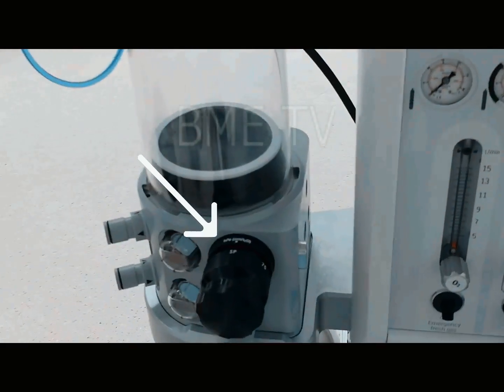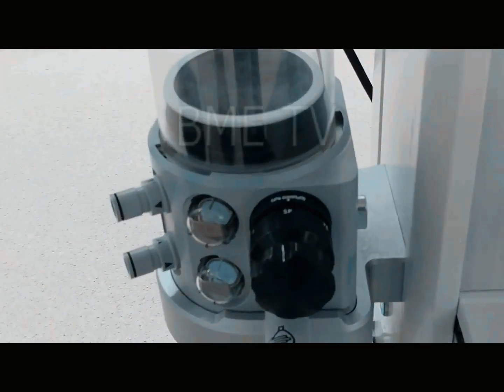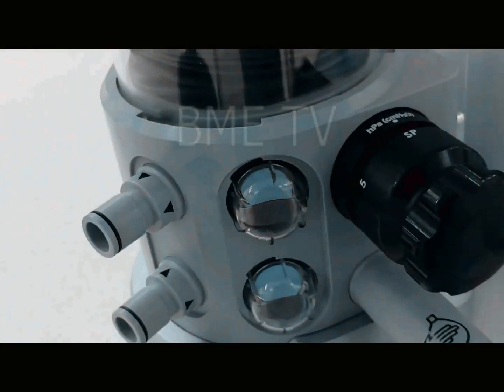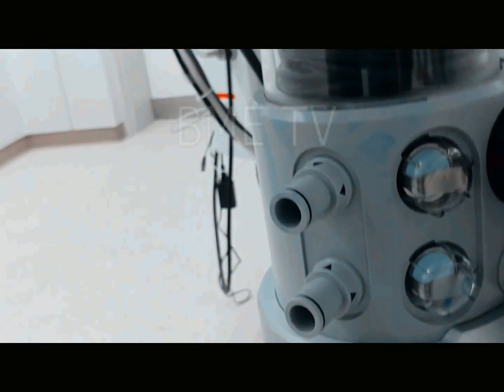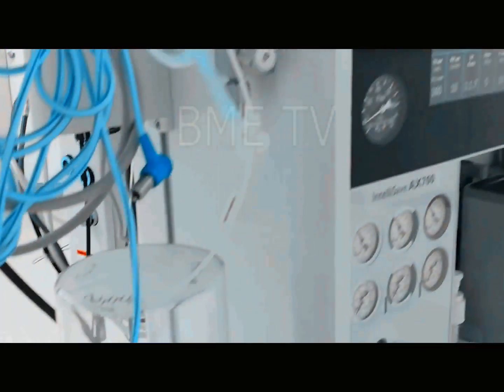First is the adjustable pressure limiting, or APL valve, and it allows a variable pressure within the anesthetic system using a one-way spring-loaded valve. At a pressure above the opening pressure of the valve, a controlled leak of gas is allowed from the system, which enables control of the patient's airway pressure. The minimum pressure required to open the valve is 1 cm H2O. A safety mechanism exists to prevent pressure from exceeding 60 cm H2O. However, be aware that pressures below this can lead to barotrauma.